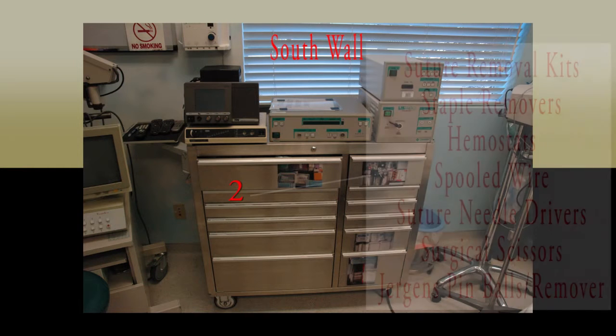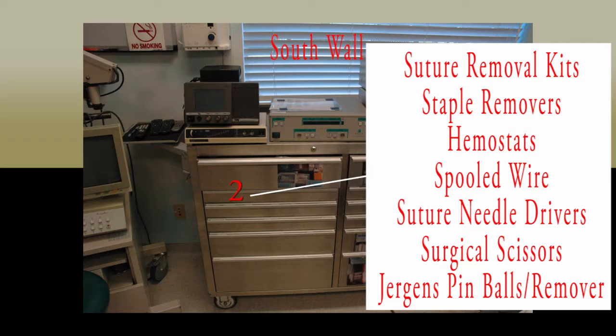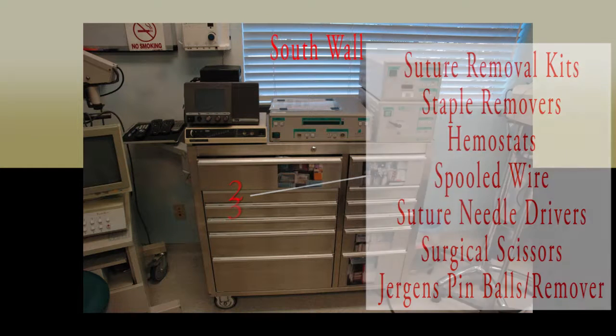This drawer contains suture removal kits consisting of a pickup and suture scissor, staple removers, single wrapped hemostats, which are locking clamps for stopping blood flow or holding things together, wire to make the twisted wire, suture needle drivers for placing sutures, surgical scissors of many different shapes, and the Jergens pinballs and removers to be placed at the end of the K-wire so as not to puncture anything or get caught when a K-wire is used for fixation.